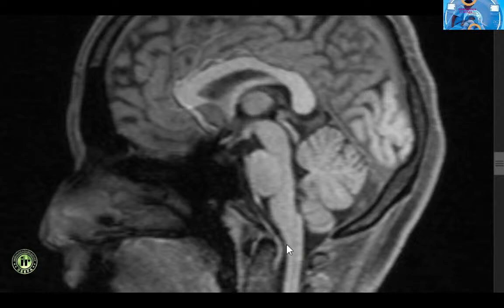The subarachnoid cisterns are situated at the base of the brain and around the brainstem, free edge of tentorium and major arteries. These cisterns communicate freely with each other. The cisterna magna lies between the medulla and the postero-inferior surface of the cerebellum. It receives CSF from the fourth ventricle via the foramina of Magendie and Luschka and is continuous below with the spinal subarachnoid space. It contains the vertebral and posterior inferior cerebellar arteries and ninth, 10th and 11th cranial nerves. When the cistern is very large, it is called the megacisterna magna.